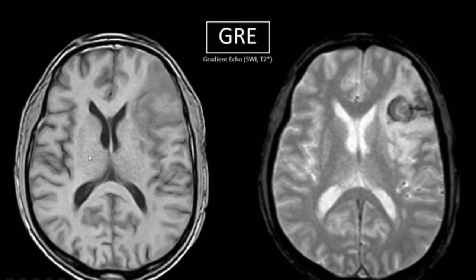So let's pull up another image here to compare. Just by looking at it and what we've been talking about, can you tell what sequence this is? So we've got myelin here, which is bright, that's fat. CSF is dark, so it's got to be T1. Okay, so let's compare. Here you can see we've got an area that looks sort of edematous, but we're not really sure why. But if we compare to GRE, we can see quite clearly that this is an early hemorrhage, and that's why this sequence is so important.